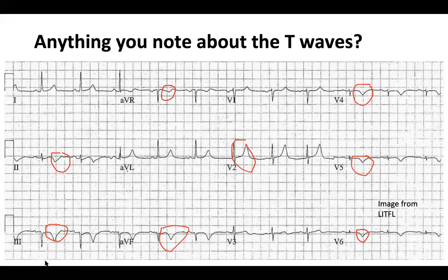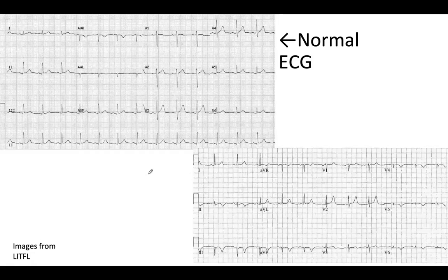So just to compare, for those of you who might be a bit confused, a normal ECG, like we said before, the T wave, so we're looking at, it should generally be positive.